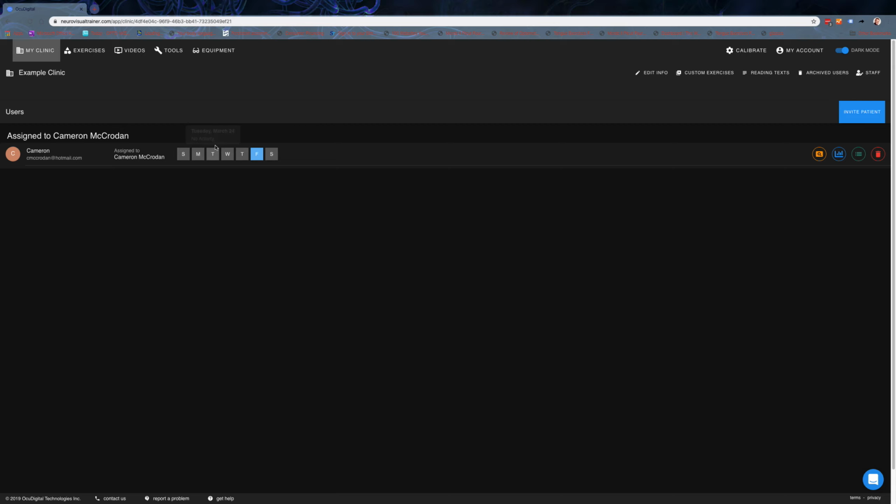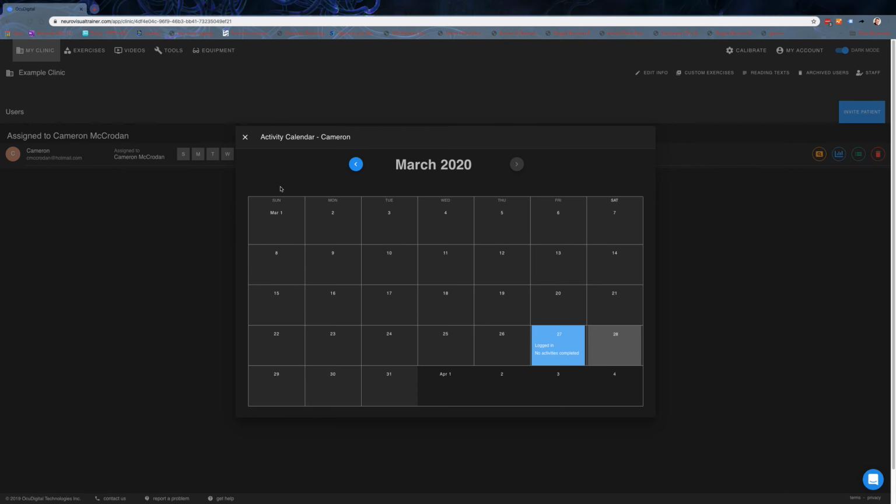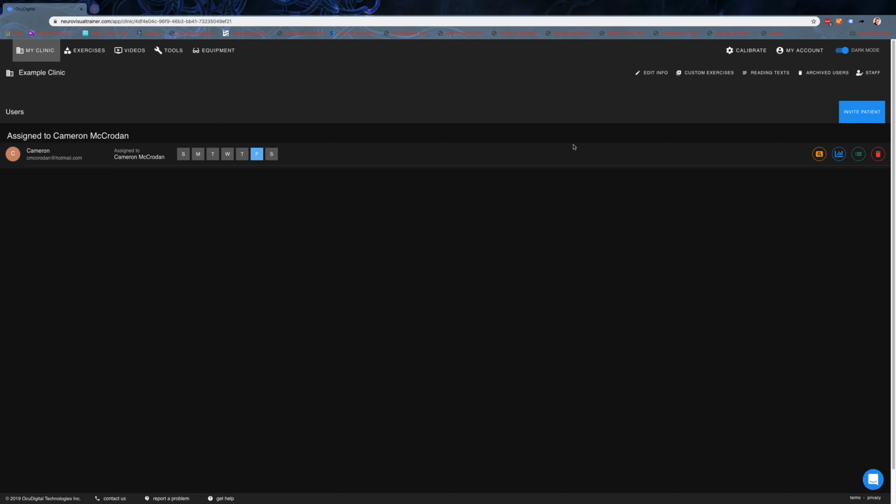and the days of the week here. So you can see what days they've actually done their home training and when they haven't. And it'll actually show what exercises and things have been completed, whether they've logged in or not, etc.